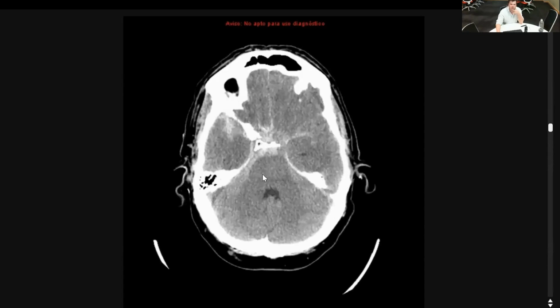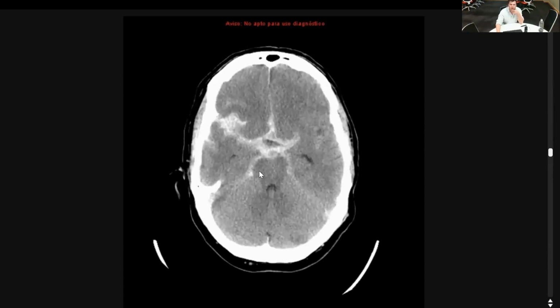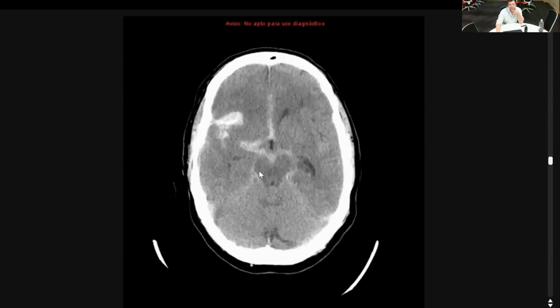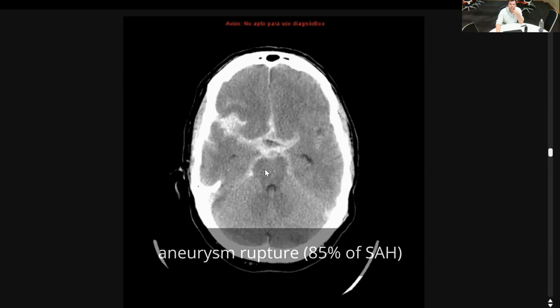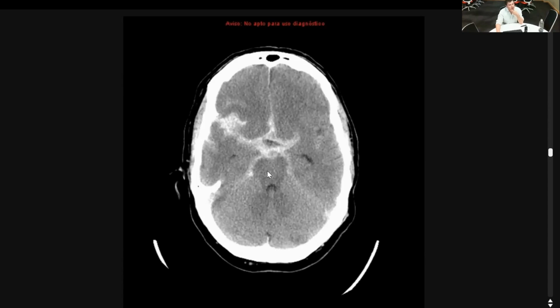So, question is, what has caused this subarachnoid hemorrhage? So I think the number one cause is kind of a berry aneurysm rupture type thing. Yeah, cool. So what are you going to do next to find out? Not sure. Dr. Nania, do you want to step in?